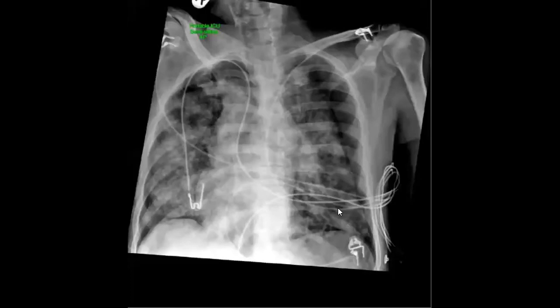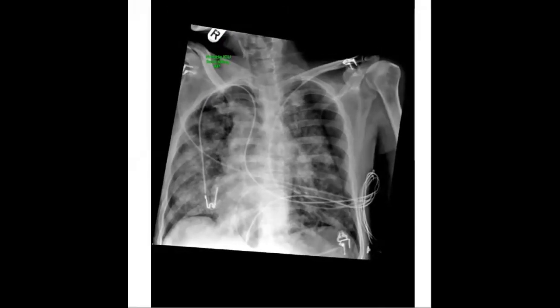But if he is an adult patient in the age of other sources of metastasis, maybe you can think about either lung cancer in a male, as in this patient, or breast cancer in a female. The good thing here, if you mention this pneumothorax, is to search for another pneumothorax, and you can see here that there is another one. So this was a bilateral pneumothorax. Okay.